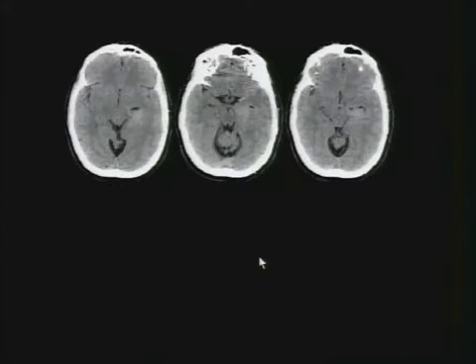This slide, I think, brings home the point that CT should not be your gold standard to image brain tumor. Here's a gentleman who presented to UCSF Medical ER with a seizure. Here's a CT done, and I think everybody in this audience could see that there is abnormality, asymmetric high density in the left temporal lobe. But you really cannot do much with this. You could say, well, there could be some hemorrhage that's resolving, maybe there's a mass, maybe not.